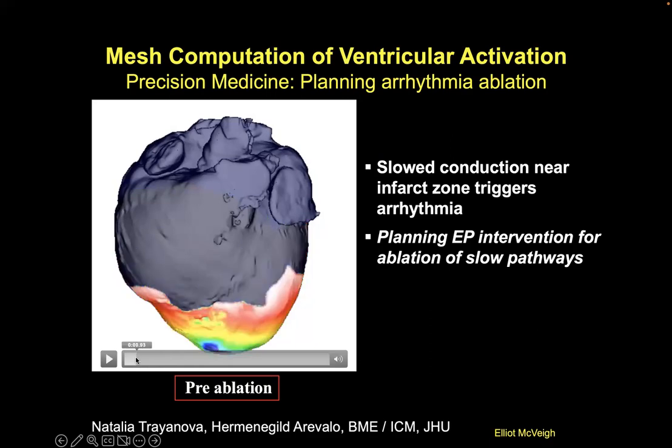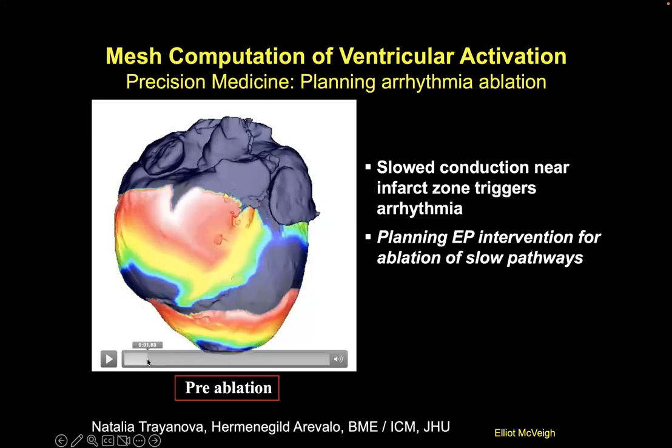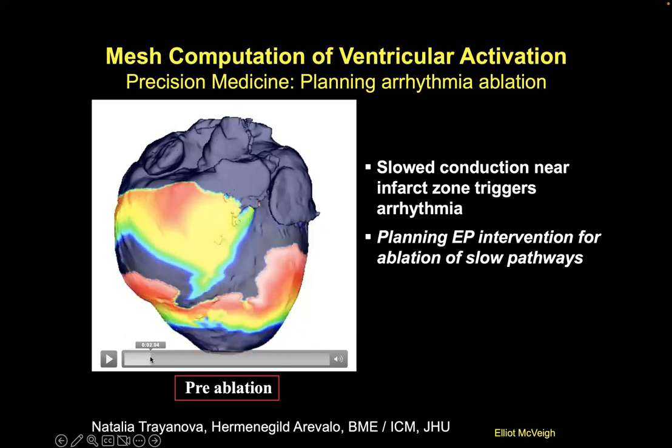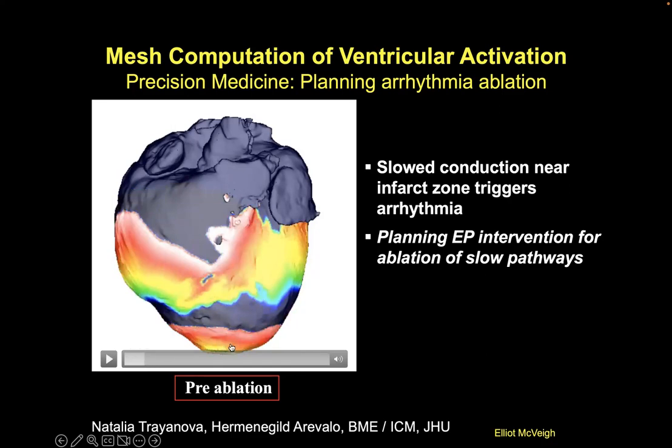So you can see it hit it, slow down, and then it's very slow to emerge out of the infarcted area. Yeah, it's kind of the same shape on the tail end. Exactly. So it's delayed coming out here. And then the next pulse comes because we're pulsing at a specific rate, right?